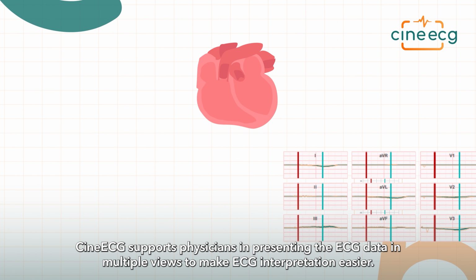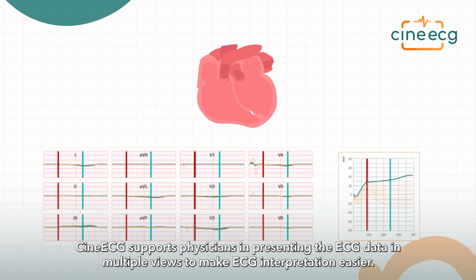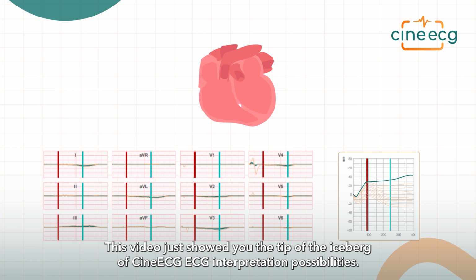CineECG supports physicians in presenting the ECG data in multiple views to make ECG interpretation easier. This video just showed you the tip of the iceberg of CineECG ECG interpretation possibilities.